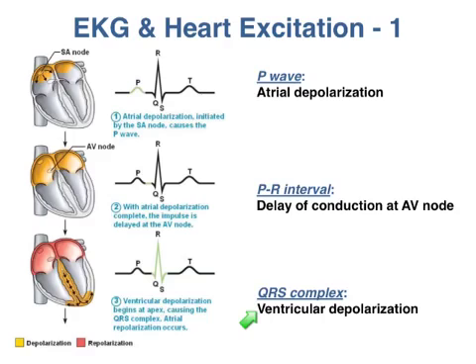Abnormalities in the QRS complex can indicate hypertrophy of either left or right ventricle. Hypertrophy just means enlargement. It can also indicate damage to the bundle branches that are supposed to conduct electricity through the ventricular myocardium.